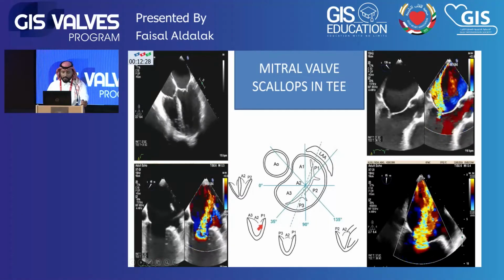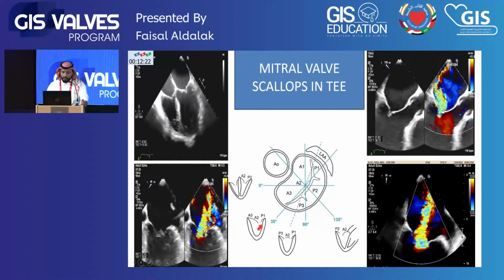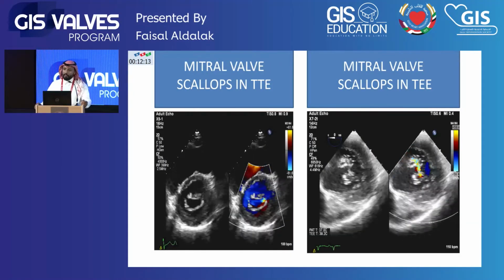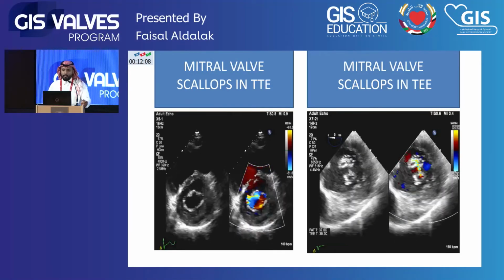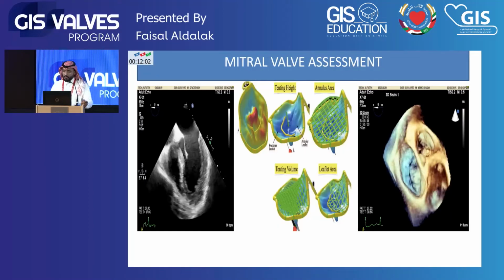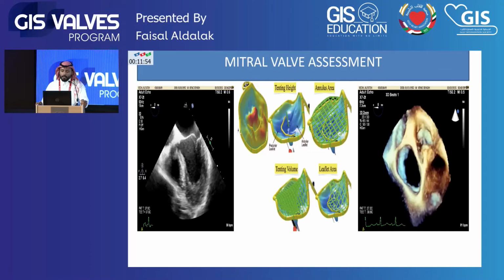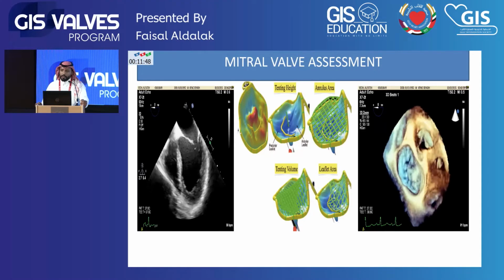If you go to slightly shallower angles, you're opening mainly the anterior leaflet. And if you go to slightly higher angles, you're going to open the posterior leaflet, because you're cutting through the mitral valve geometry. The mitral valve in the short axis view, whether in transthoracic or transesophageal, gives you a better idea about where exactly the jet is coming from. And you can confirm this with transesophageal echo with 3D and color. If you also use QLab, that can give you more details about the mitral valve, the anterior leaflet, the posterior leaflet, and there are a few measurements you'd need to do.